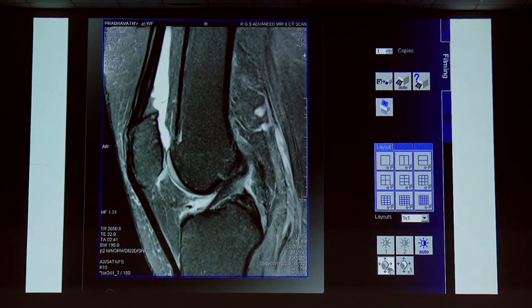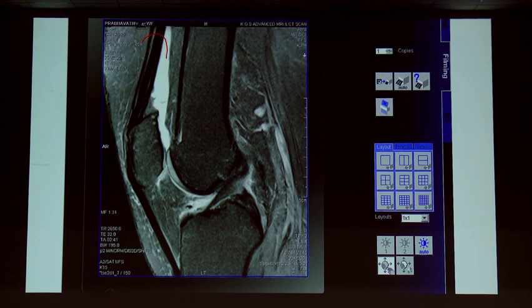Let's start with anatomy. What you are seeing is the quadriceps tendon. You can see this is the full course of quadriceps tendon. It is a quadriceps tendon, vastus intermedius and vastus lateralis and vastus medialis together. Then this is the full course of patella, and what we are seeing is the patellar tendon insertion over the tibial tubercle. This is one. So all this together we have to carefully look.